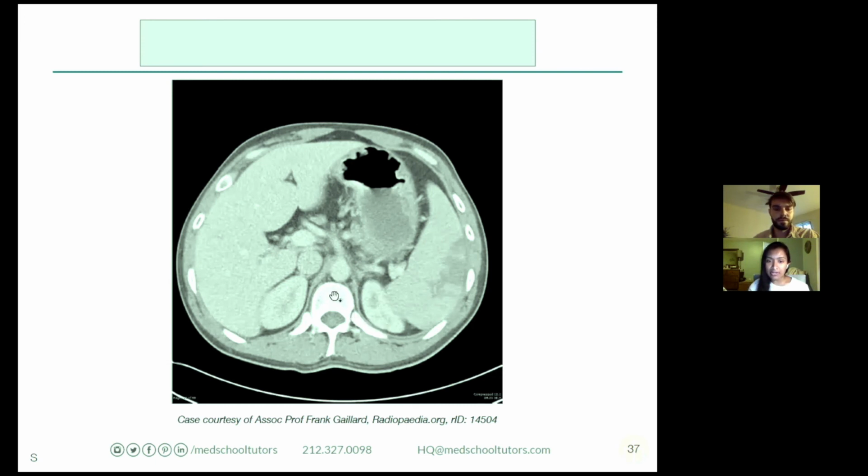immediately in front of the aorta, immediately in front of the vertebral body, so the aorta, right? IVC, looking at the stomach here, looking at the spleen here. It looks a little bit big on this slice, but might just be normal. And so the real question is, do any of these things look abnormal to you? Anything jumping out on these images here?